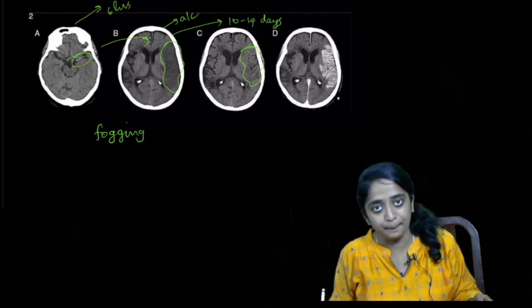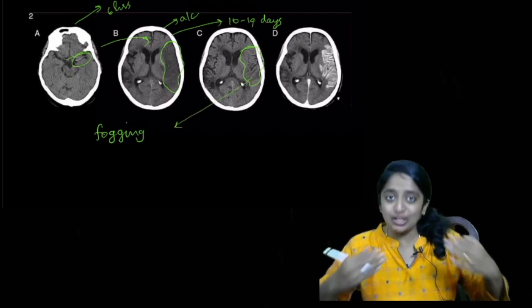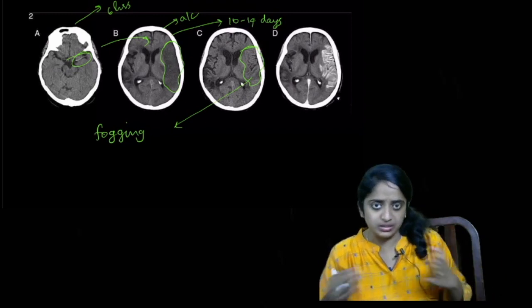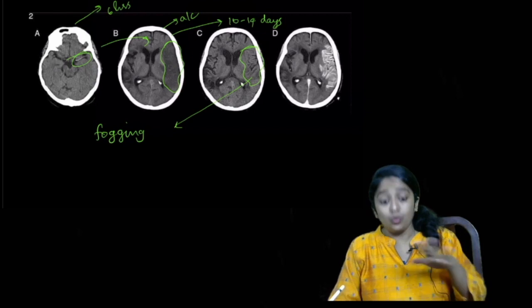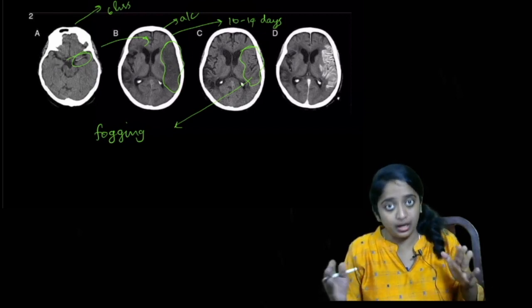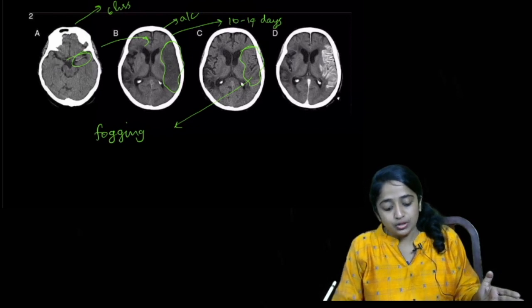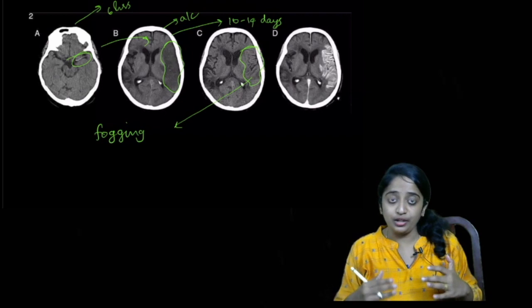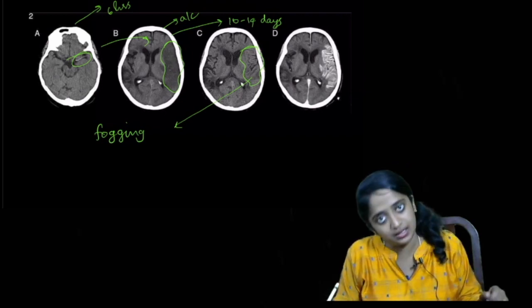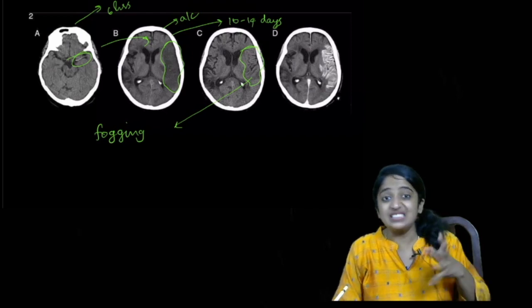What is happening? This is known as fogging effect. So, imaging done say 1 or 2 weeks after the onset of insult, where there is an established case of acute infarct, the brain looks normal. So, what is actually happening here? As we said, our body is trying to take over some defensive mechanism. So, there is proliferation of capillaries, but these are very leaky.